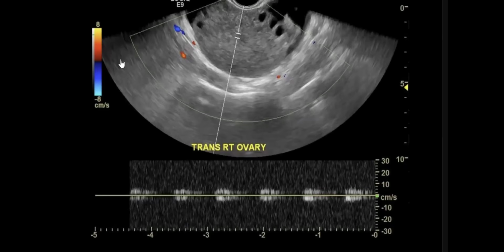And the final one is the ultrasound. Again, enlarged stroma, central stroma devoid of follicles. Follicles are displaced to the periphery. But when we see Doppler, Doppler is insensitive. Enlargement on B mode, grayscale ultrasound, is a very sensitive sign. Enlargement is the most sensitive sign. The second one will be abnormal location. And of course, you have to compare.